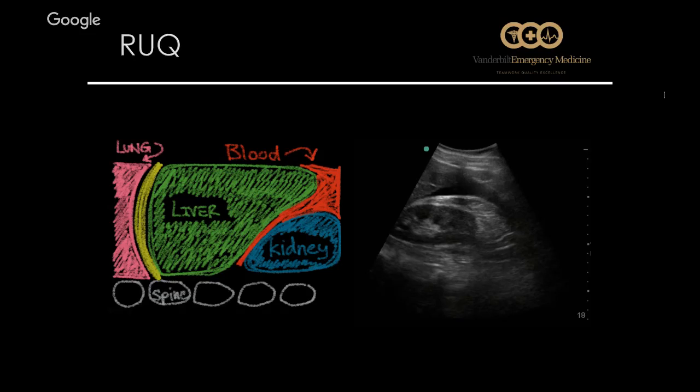Another example. This time you can see the fluid closer to the tip of the liver, and it's more inferior. There's actually quite a bit of free fluid here. Again, pointy black free fluid. Next slide.